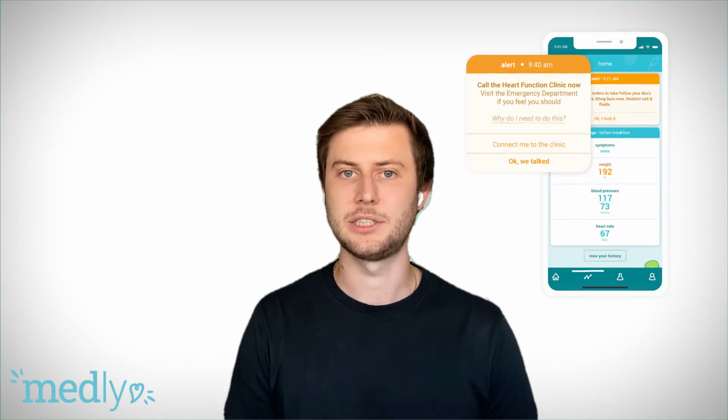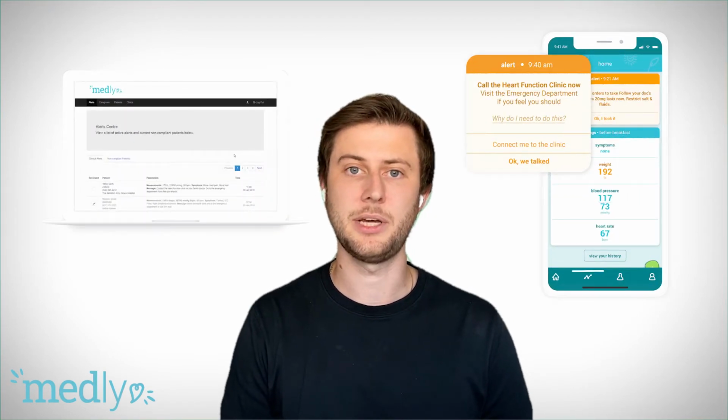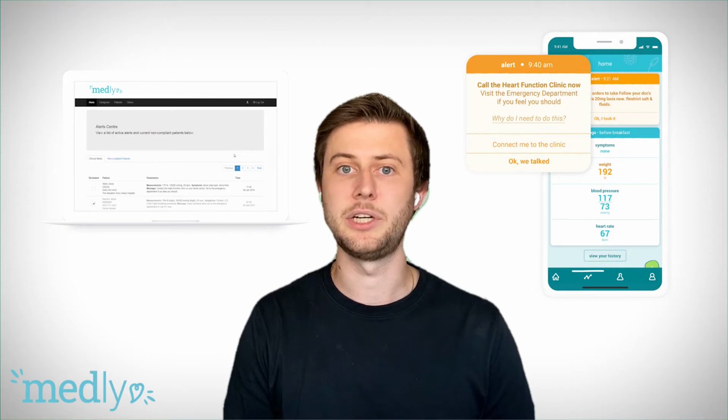Today I want to give you a quick look at Medly and show you how it works from both the patient and the clinician side of things, from taking your readings as a patient down to how you interpret an alert in your readings as a clinician.